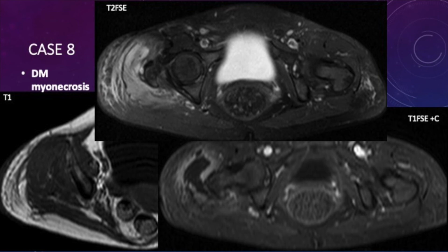This is not a sarcoma or a tumor. And so you have to be able to see that difference between what a discrete tumor looks like compared to an infiltrative process within the native anatomy. So now we're going to move on to the bony MRI.